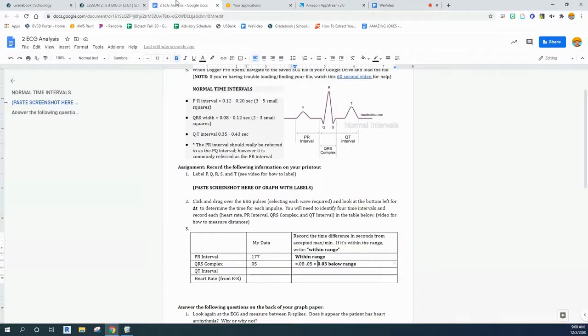Hopefully that's sounding to you like a proportion. So let me write that down. 8 beats equals 7.079 seconds. I can set that up to X beats equals 60 seconds. So I want to set up that proportion, and hopefully this is starting to look familiar to you. If I underline, you can see that these are fractions: 8 beats over X beats is 7.079 over 60 seconds.